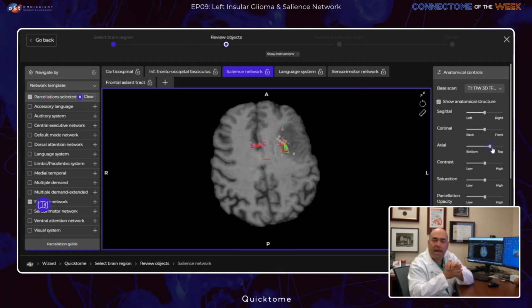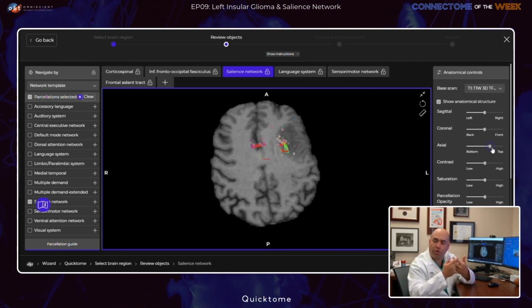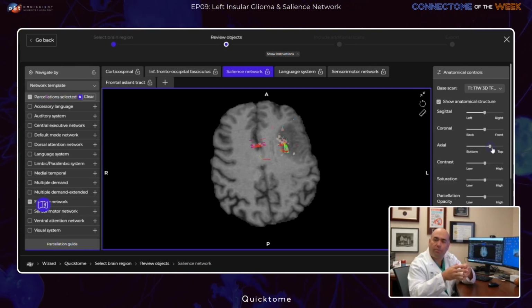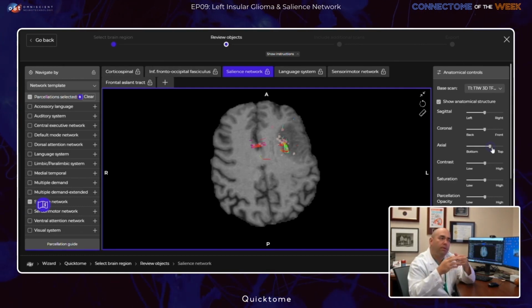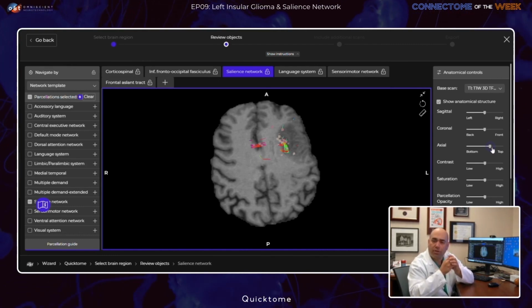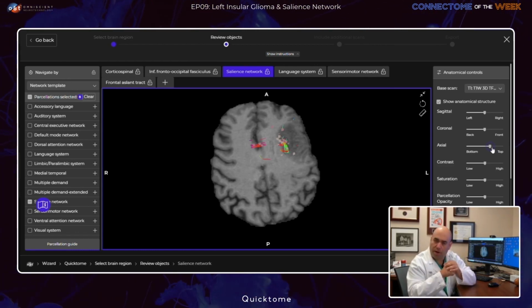What I have for you now is the same patient's post-operative day 1 MRI. During the operation, which was done awake, the patient did begin to suffer from aphasia, and we halted the resection at that point. The deficits persisted after the surgery, and I wanted to determine whether or not there was some damage caused to these networks beyond what our traditional post-op MRI would reveal.